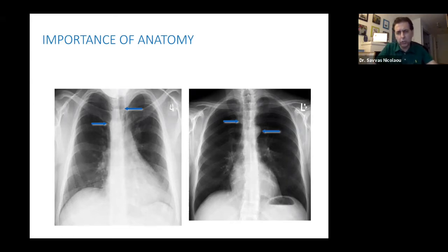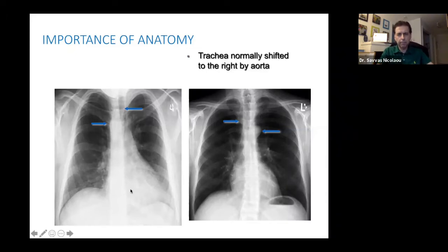That implies this patient could have congenital heart disease. You have to recommend an echocardiogram. The only way you can recommend an echocardiogram is by identifying this abnormality initially on a screening chest radiograph, by identifying the normal and abnormal anatomy.